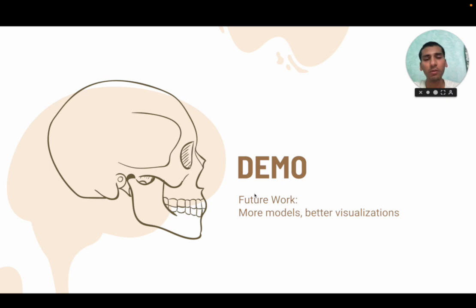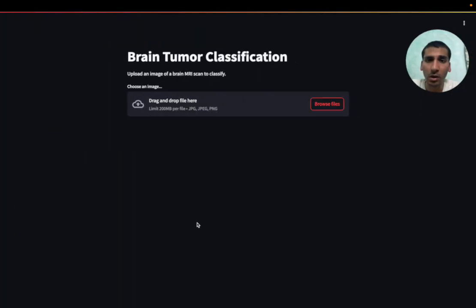And now I'm going to go to the demonstration part, but just for future work consideration, you can train other models, you can work further on these models, you could integrate more things into the whole project itself. You can also work on better visualizations. But now let's take a look at how this thing looks.